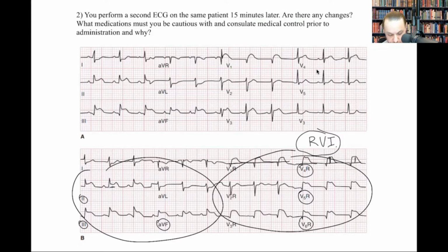We see also, right, it could be the right coronary or it could be the left circumflex that can also be feeding the inferior wall MI, right? So this could be a full right coronary artery occlusion, plus you may have a lower portion of the circumflex that's also infarcted, right?